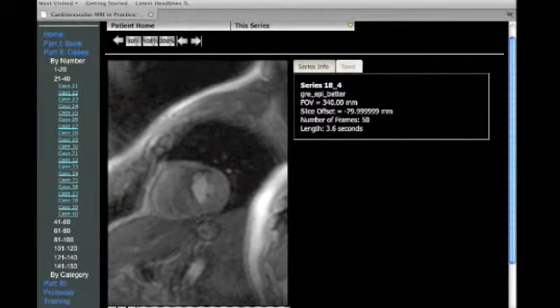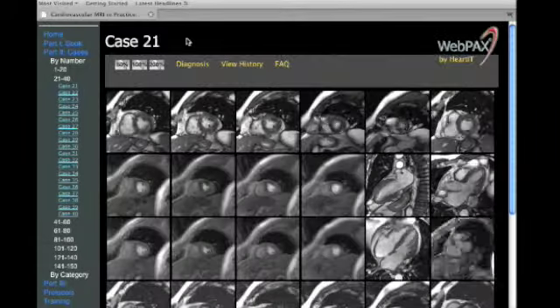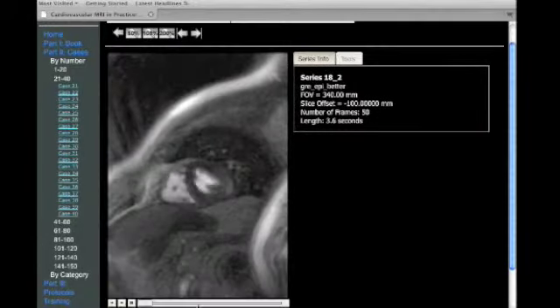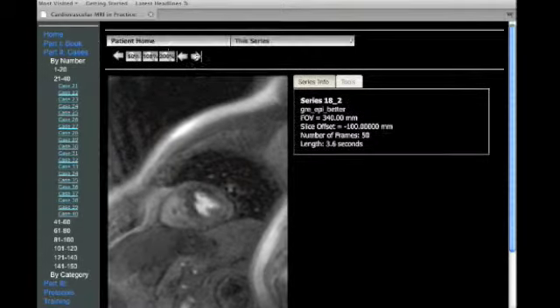On these images, it is noted that the subendocardium and myocardium of the anteroseptum and anterior wall show a perfusion defect that is persistent throughout the stress images. It is seen on multiple levels as well. This is true at all levels scanned on these short axis perfusion images.